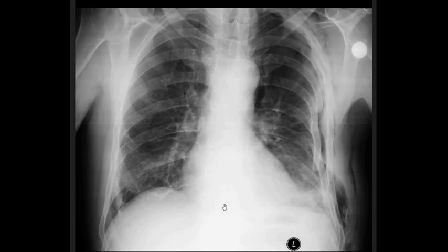So let's now look at this picture. Here we see that this is a correct lung field, nothing special to see here. But as we see here, we see asymmetry. The first thing we can identify here is that the ribs are broken if we compare them to the healthy side. From the second to the sixth or seventh rib, there are broken ribs.